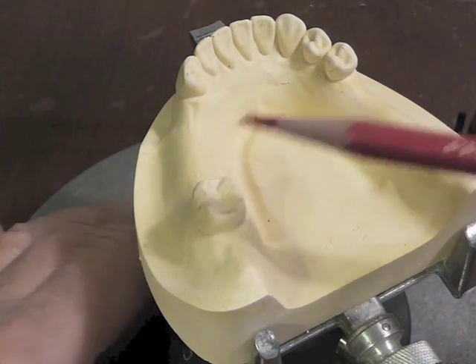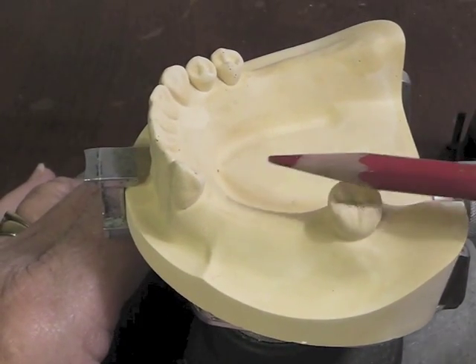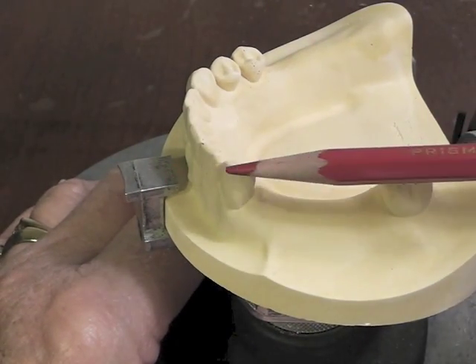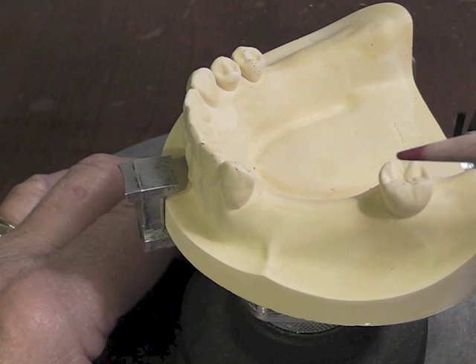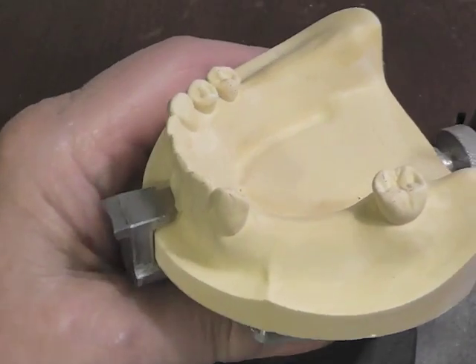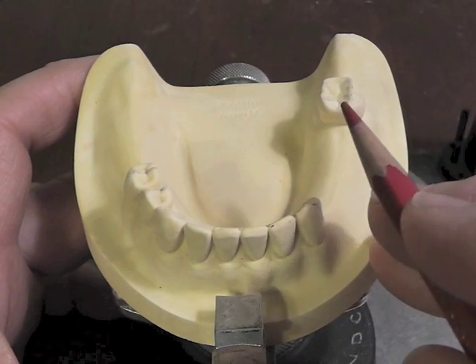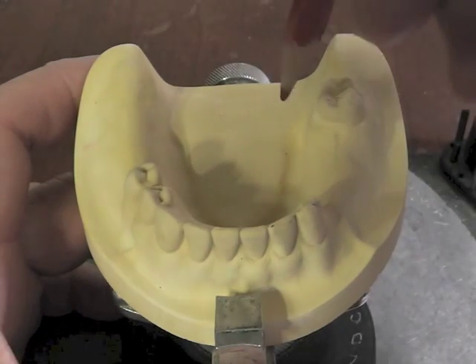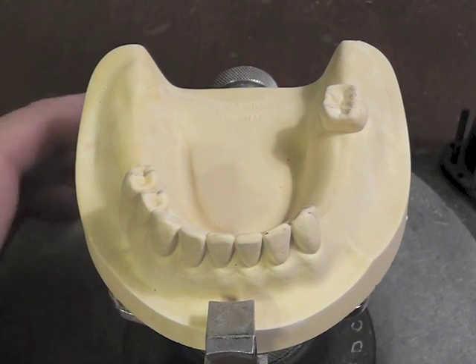This particular molar over here is our primary abutment, and on the primary abutment that is this molar, we can do very rigid clasping. It's also on a tooth-supported side, so we can do very rigid clasping on this tooth. So because of that, we would be thinking a cast circumferential clasping system on here. And we would ideally like to be able to put a mesial rest and take a couple of arms, one to the distal facial or one to the distal lingual, depending on where our undercuts are located.